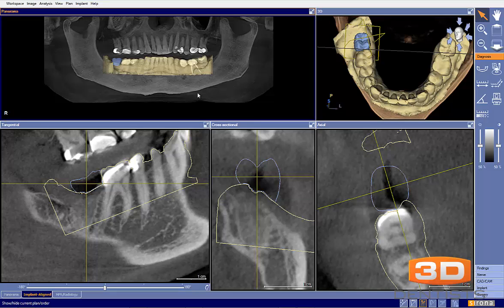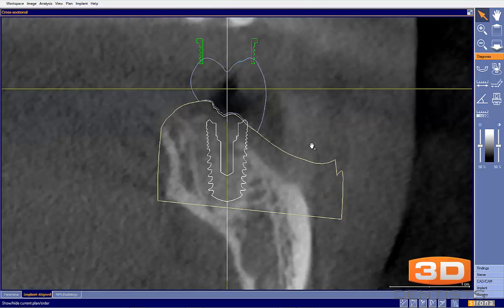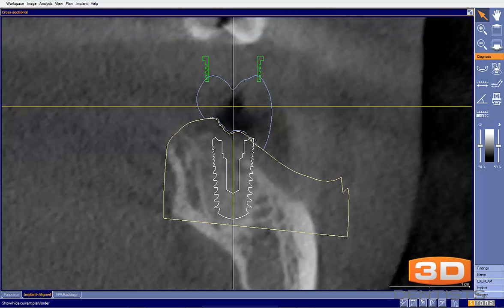Now let's focus on the implant plan. So this is the plan as submitted, and while I have it, let's go ahead and take a look. Based on where your margin is drawn, we have no ability to develop an emergence profile. In other words, our tooth would have to, right here we could develop a nice emergence profile, but right here we would literally have something like this.